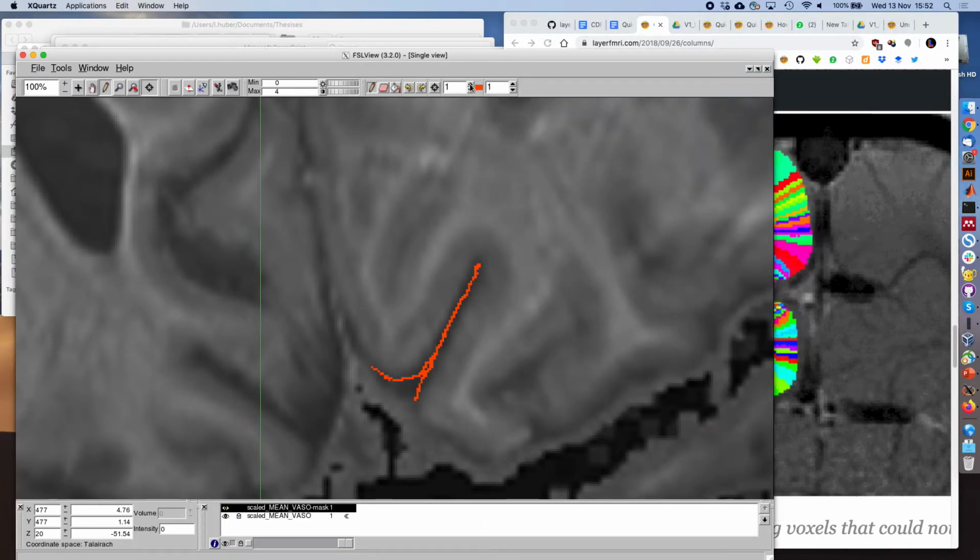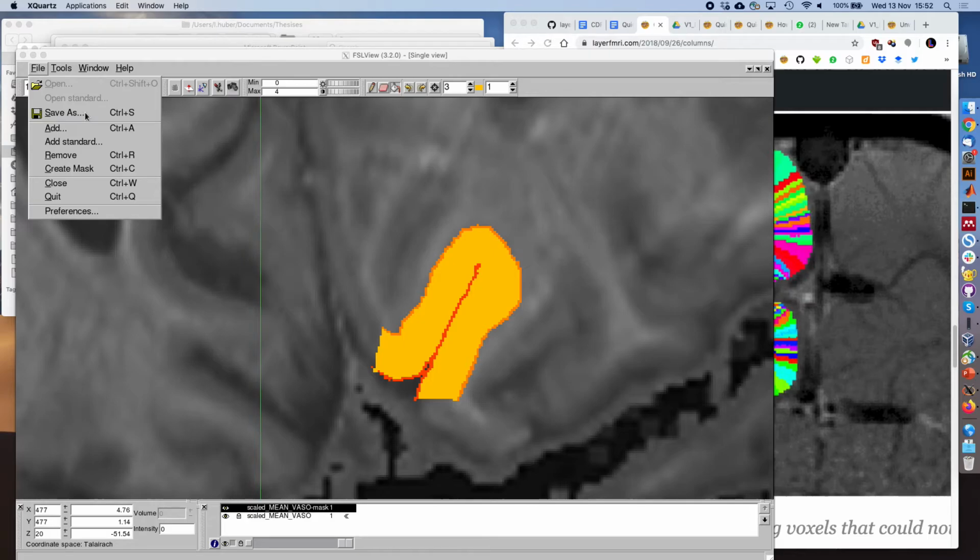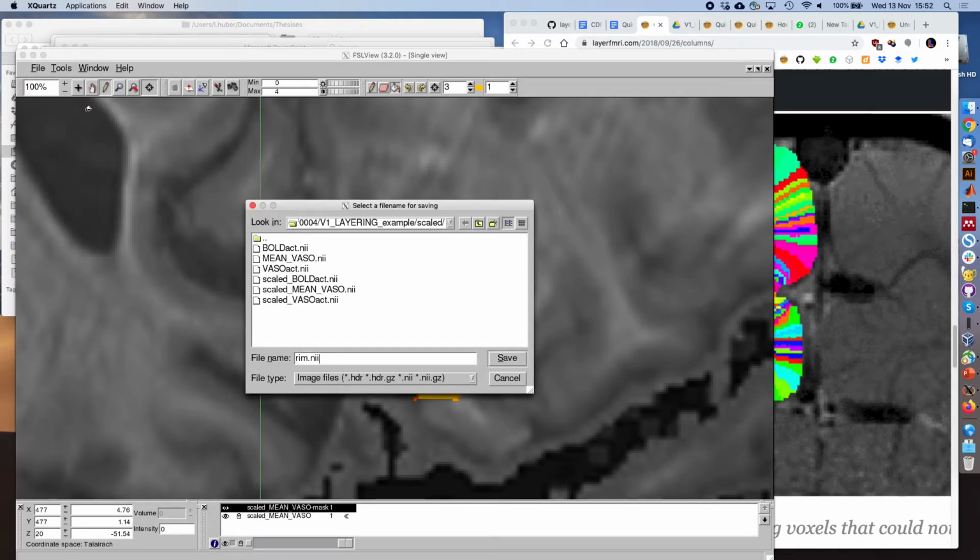Okay, we have more than 8 minutes left, probably. So let's quickly draw the gray matter white matter border here too. And since Alessio joined us, this is obviously the manual version of how you can do it. But you can also get those more elegantly with his ways of doing things. And in fact, I said that earlier too, so not just because you're here. It's recorded. So again, we save it as rim.nii.